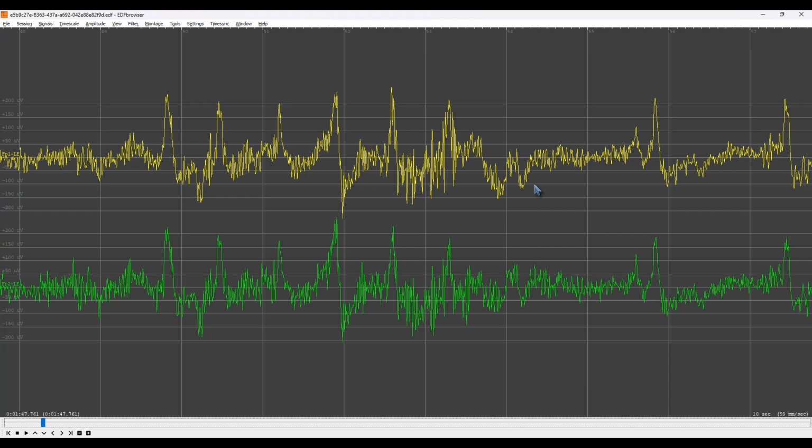And this is also what we would use to play back a recording of a brain map. So Jason and I will use this if we're on a call with a clinic and they say, yeah, I had some weird stuff come up, and we'll request that EDF file from them for the brain map, and then we can go through and look at it and actually see the signals.